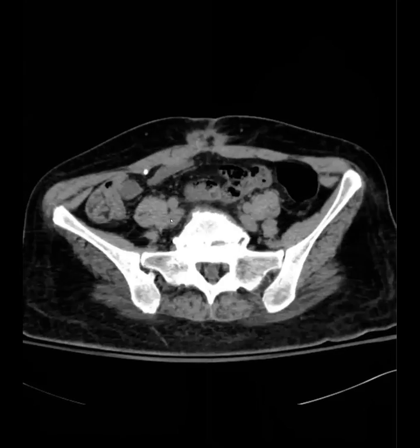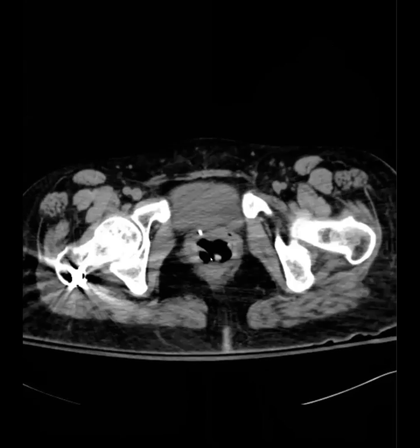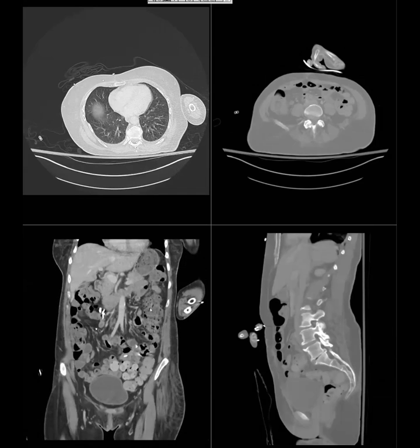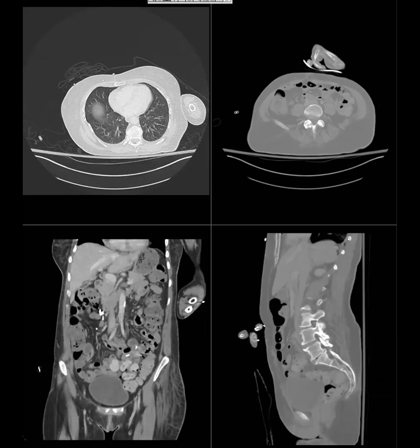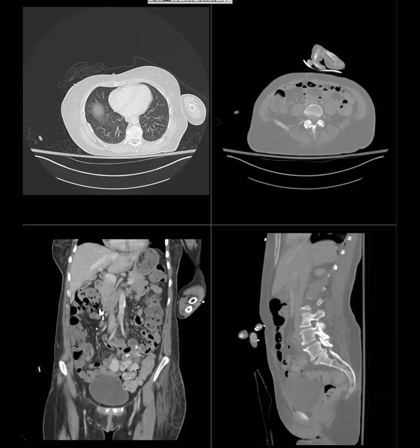So just to say that you've seen some things that can go wrong with CSF shunts. So are these eroded or are they placed wrong? I think they're eroded. Yeah, they erode. Your body's not as strong inside as we are outside. There's no skin, and things can go wrong because it's a plastic tube up against bowel that has the potential to erode.